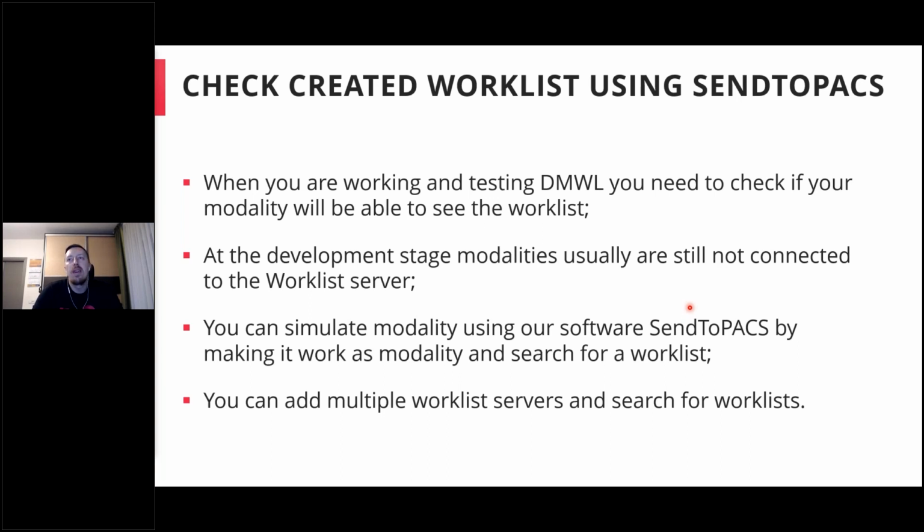So for this, you can use our tool called SendToPACS. Of course, it's used for many other features like sending DICOM or non-DICOM files to the PACS, but it also has this MedDream worklist search functionality, which allows you to search for a specific worklist server, a specific patient, a specific date, and so on. So it can simulate a modality, and with SendToPACS you can search the worklist and see if it's coming, if it's showing correctly, and all this information.